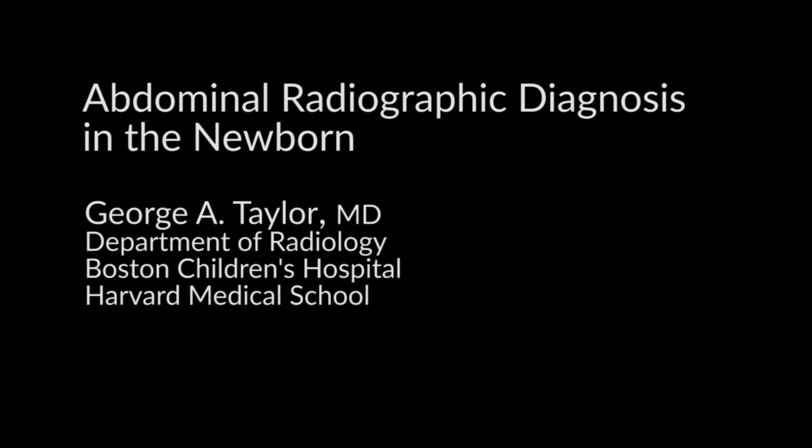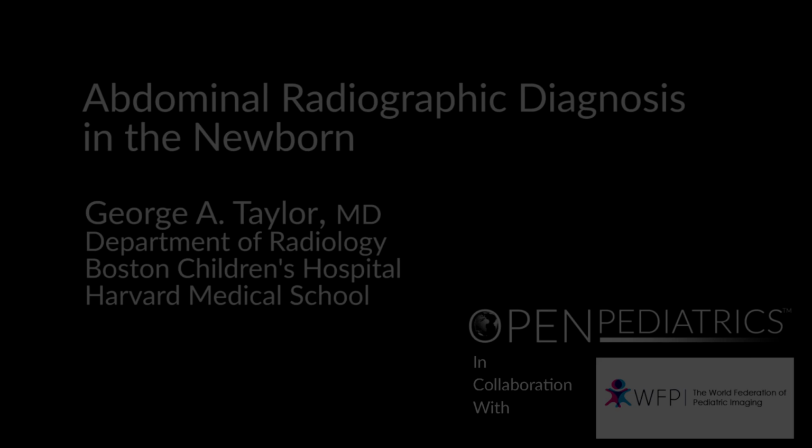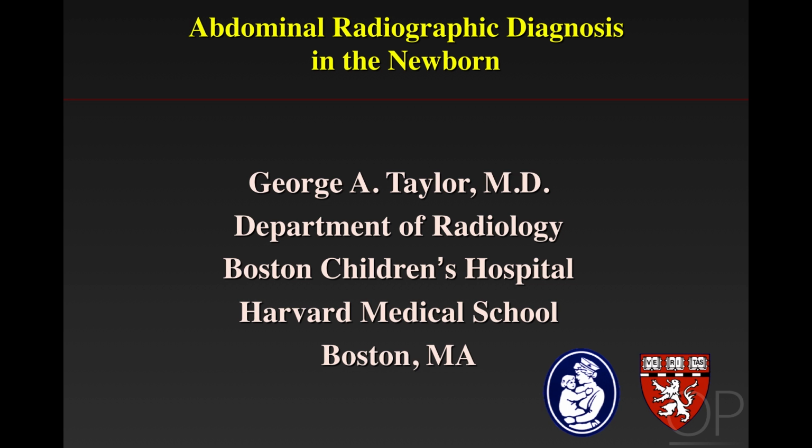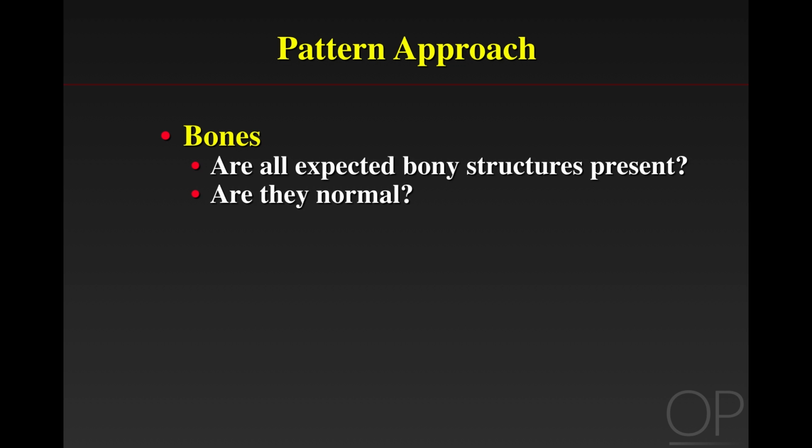Abdominal Radiographic Diagnosis in the Newborn by Dr. George Taylor. Today we will be discussing an approach to abdominal radiographic diagnosis in the newborn using a very simple algorithm that was taught to me by Dr. Rita Teal, a very important mentor of mine, and it uses the mnemonic bones, stones, gas, and mass to organize our visual approach. Let's begin with bones.